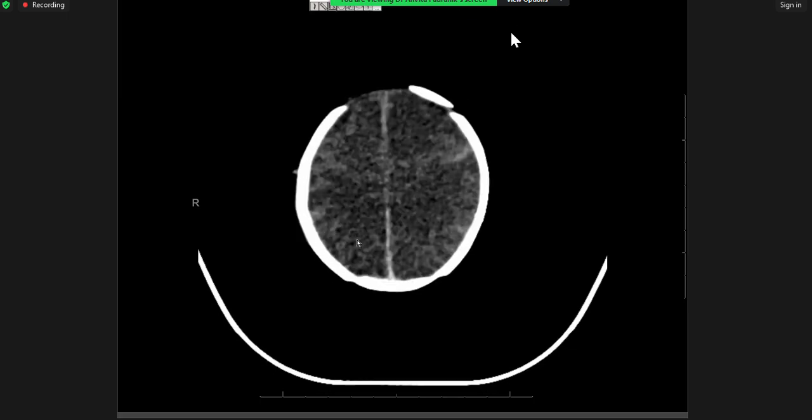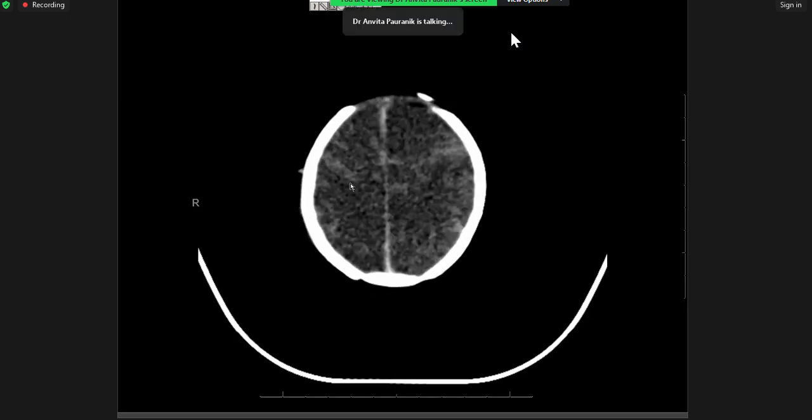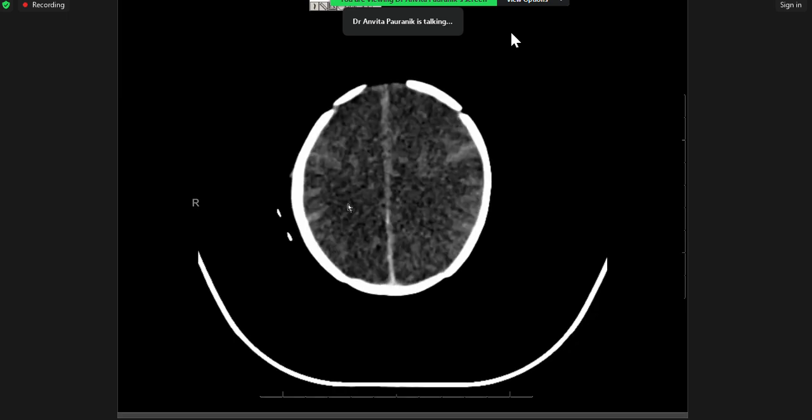Okay, so this one is more florid, very unfortunate. Obviously, their prognosis was dismal, and they had to withdraw care. They were not even able to do any follow-up MRI. So this is an extreme example of what severe hypoxic brain injury can look like in a newborn.